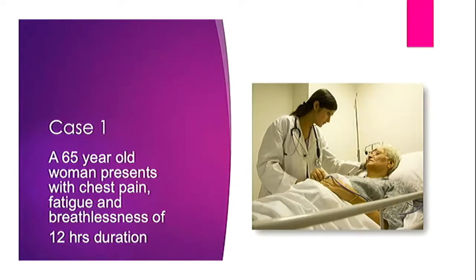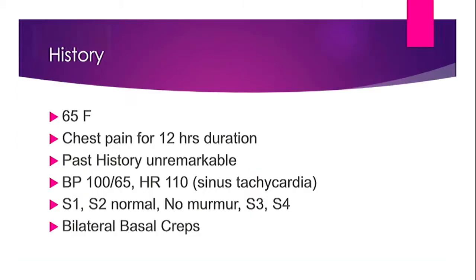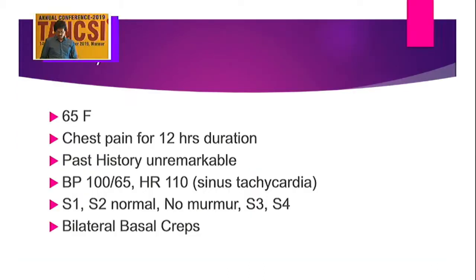Very good morning to one and all, and let me set the ball rolling by presenting an interesting case, a case of acute reversible LV dysfunction in a patient. Our patient, a 65-year-old female, presented to us with acute onset chest pain, fatigue and breathlessness of 12 hours duration. The past history is unremarkable.